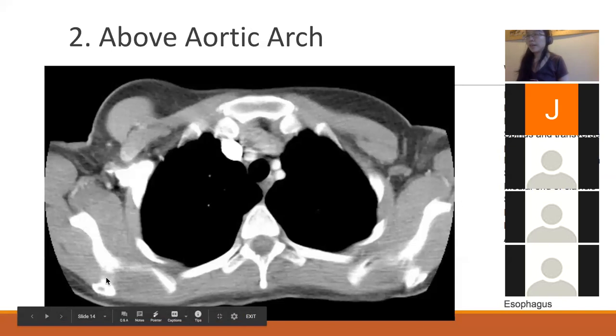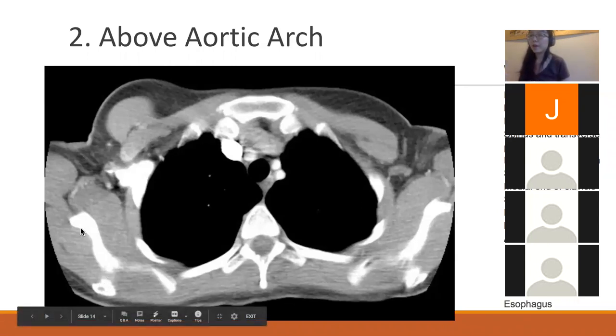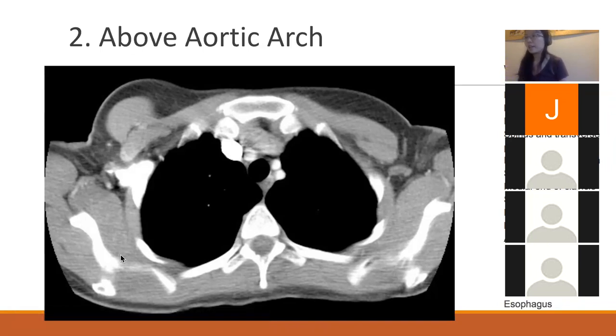Okay? And then what do you guys think these dots right here are? Well, if you remember back to the osteology, the scapula has something called a spine, right? And that's really important because that separates all your rotator cuff muscles out.